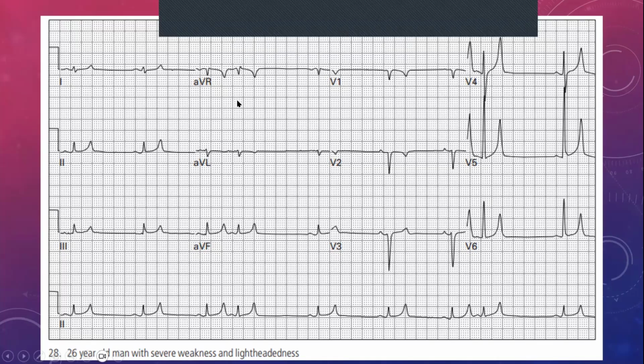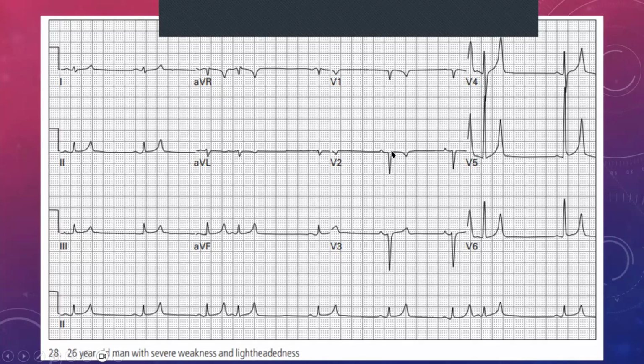All right. Now, if we come to the chest leads, if we look at V1 and V2, we can see they both got Q waves. So Q waves are quite indicative of ischemia sometimes. And we can see that stretches on to lead V3, and you can see there's even maybe a bit of ST elevation. So there is a possibility of an ischemia. When we get to lead V4, V5, and V6, what we notice are these very tall T waves that are coming up over here, all right? And the one thing that I want you to notice is that they're quite pointed.